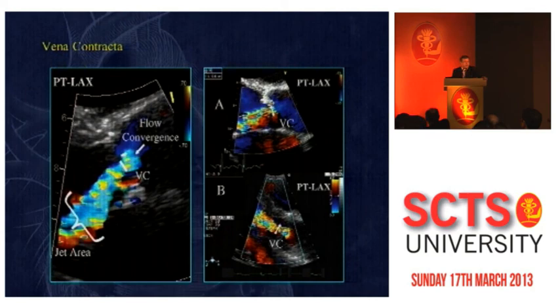So now you can calculate the flow rate because you can calculate the surface of this hemisphere. You have the radius, so the surface of a hemisphere is 2 times pi r squared. And then you have the velocity. And if you have a velocity in centimeters per second multiplied by square centimeters, you get cubic centimeters or mLs per second. So now you have a flow rate.